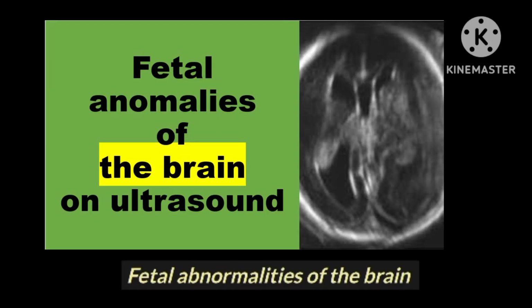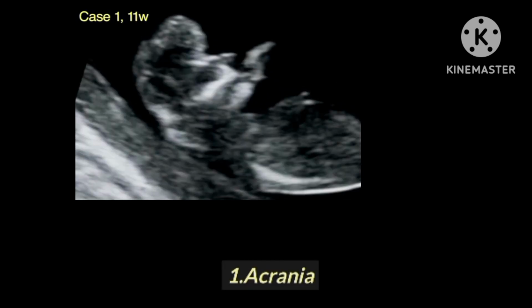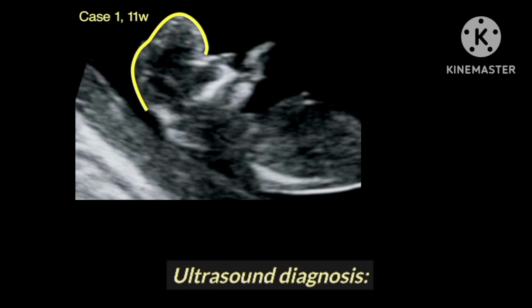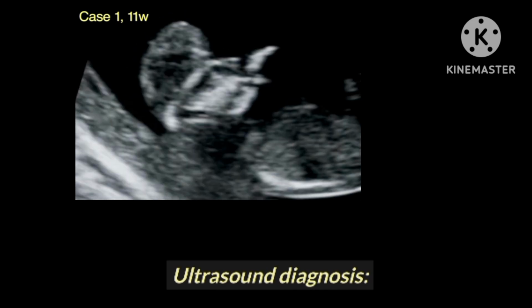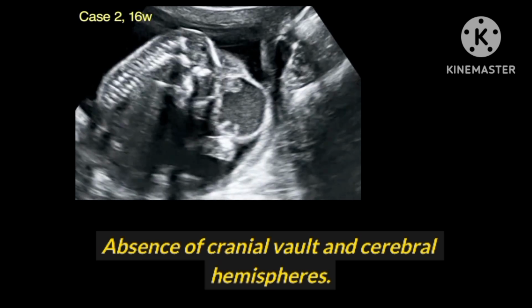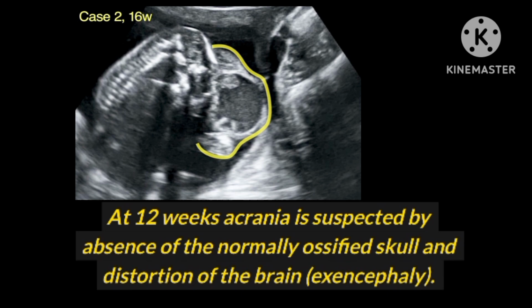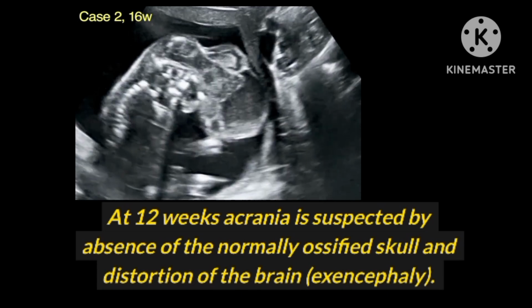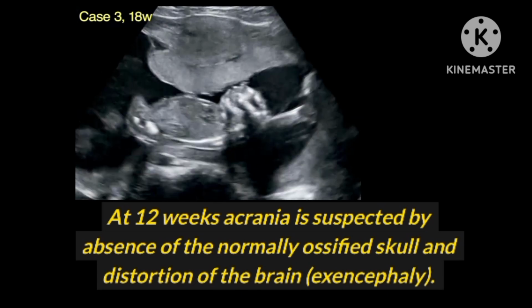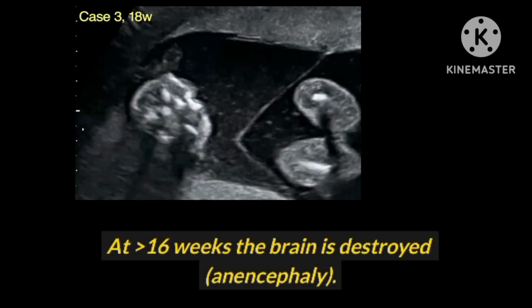Fetal abnormalities of the brain. Number 1. Acrania. Ultrasound diagnosis. Absence of cranial vault and cerebral hemispheres. At 12 weeks, acrania is suspected by absence of the normally ossified skull and distortion of the brain, exencephaly. At greater than 16 weeks, the brain is destroyed, anencephaly.